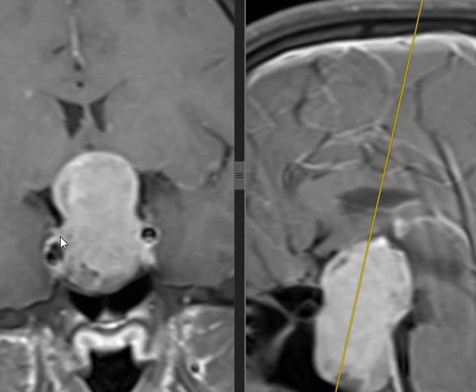I don't know if you have seen the Frozen film, Elsa's snowman. We said figure of 8, snowman, or waist sign, it has a waist. So this is very typical of pituitary macroadenoma.